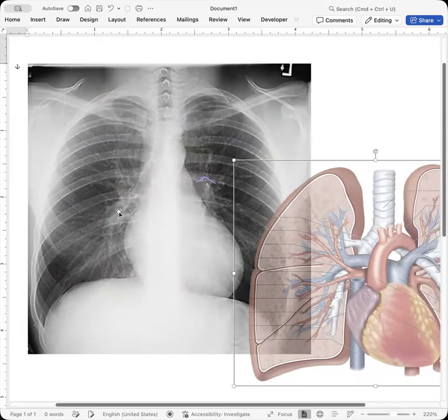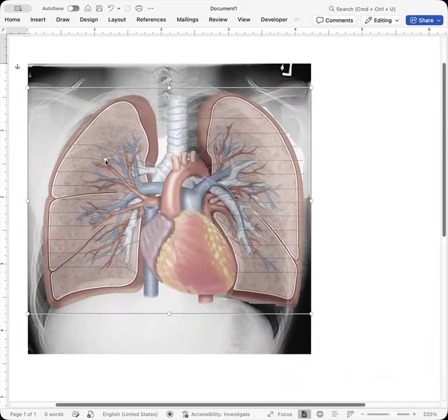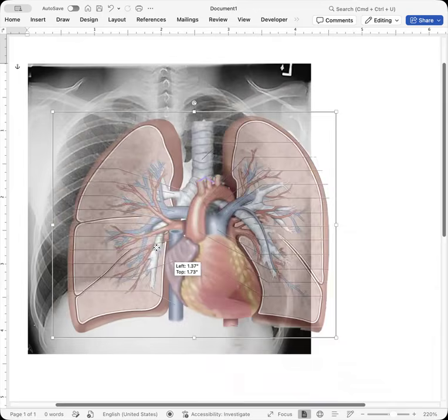What we're seeing with all of these streaks here, we call them vascular markings. If I overlay this, this is what you're seeing there. And that's something you want to see. That means we got good technique. That means the lung tissue is kind of functioning. That's an important thing to see on an X-ray.